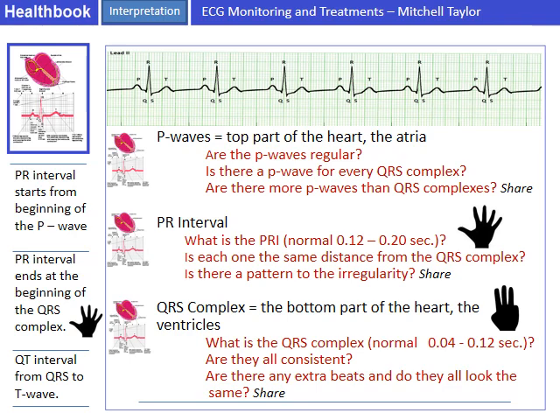Normal sinus rhythm. Sinus is what? That's right, a P with every QRS complex. And is this a regular rhythm? Yes, it's a regular rhythm. So we have a normal sinus rhythm, rate is 60, and now we're going to do the PR interval. So how do we do the PR interval? We begin with an isoelectric line, straight, and then when it starts going up, you'll see it thin a little bit. It starts upward, and that's the beginning of our P wave.